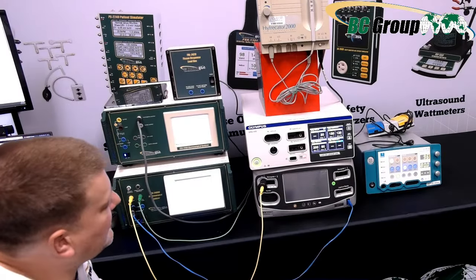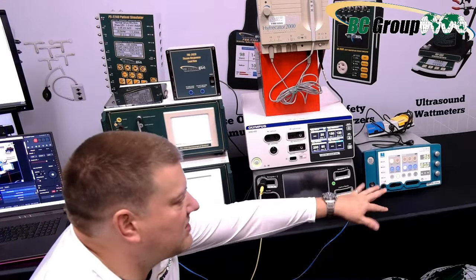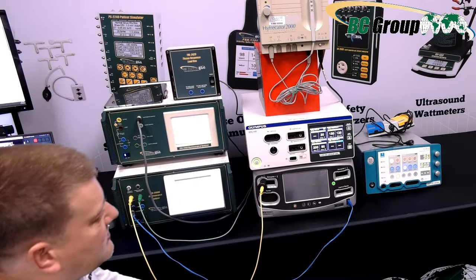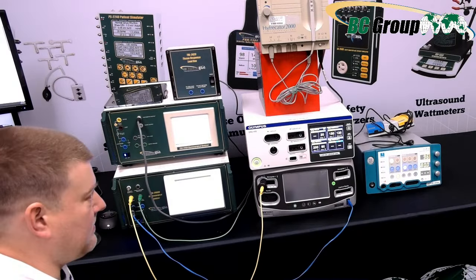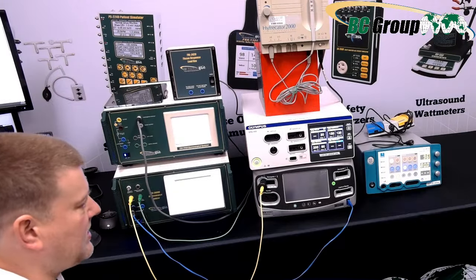And I was playing around with it yesterday, and I had some very interesting results because it's kind of a semi-intelligent ESU. Not that these ones aren't, but that one there, it's got some little quirks to its programming. So anyway, guys, most of you probably have this Covidien FT10. Olympus has gained a lot of market share, so you're going to be using a lot of that as well.